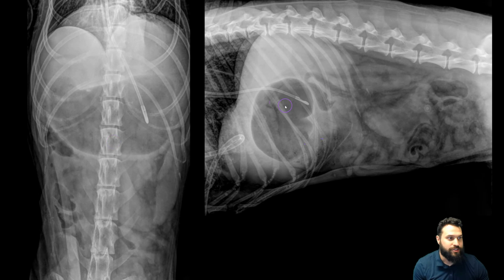In our lateral projection, there are a few main things that made me think about 360-degree GDV. The first is that the stomach is quite distended. It's got a bunch of heterogeneous material within it, but then also a gas cap positioned here. This is a left lateral projection, and actually there's no displacement of any of the structures. We certainly can't tell if there's compartmentalization in the left lateral only, but there's nothing screaming classic GDV from that gastric positioning alone.